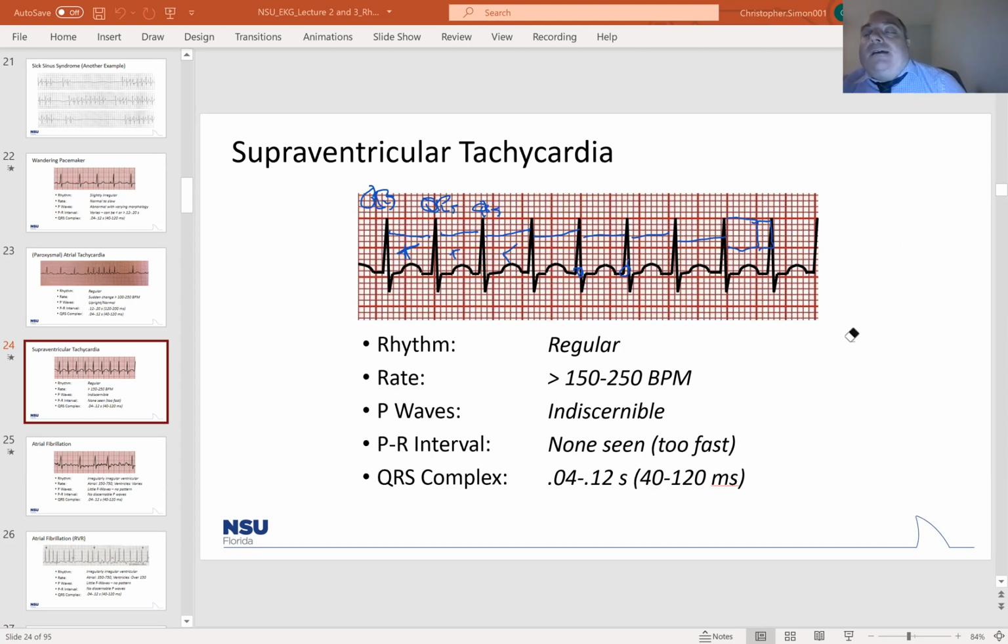So that is an atrial arrhythmia. Okay. It's one that we need to worry about, because some of these rhythms are what we call terminal rhythms. In other words, you just can't live in them for the rest of your life. So if you went into SVT, you'll probably be okay for a little while. You're not just going to keel over and die in 1 second.